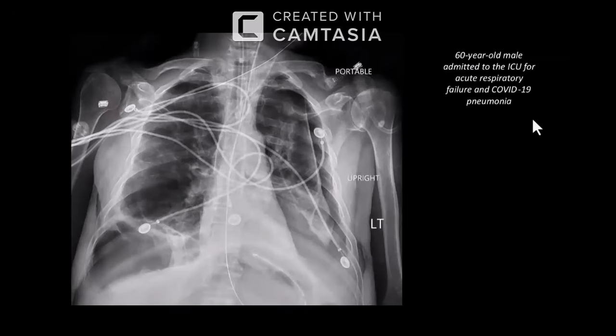Now I can see that there is an area of lucency lying in the left side of the lung, with passive collapse of the left lung. There is a pneumothorax noted, and with this there is a flattening of the hemidiaphragm. So this is the left hemidiaphragm. So this is a tension pneumothorax, and this needs to be urgently informed to the on-call surgical team for urgent drainage of the pneumothorax.